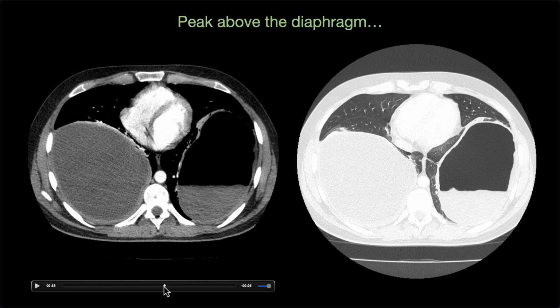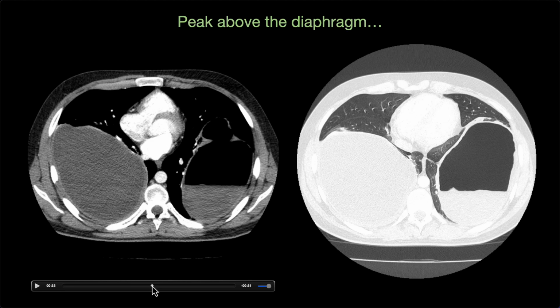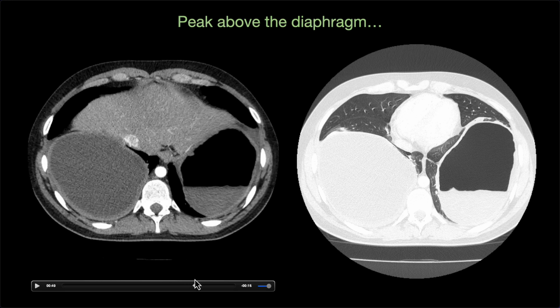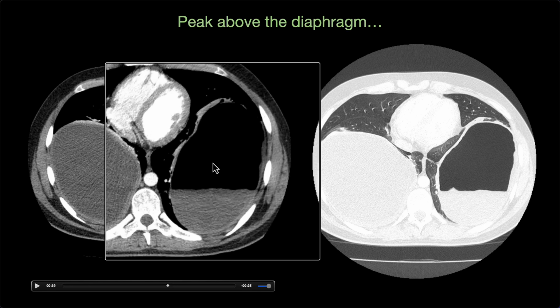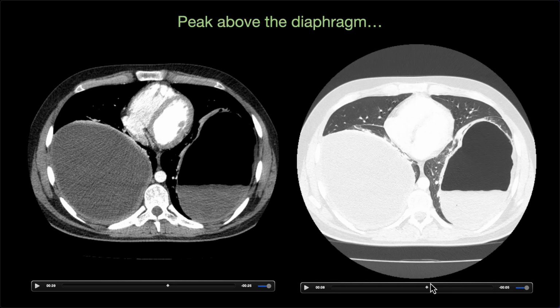When talking about hydatid disease, it is unavoidable to also talk about lung involvement, as it can be quite common in addition to involvement of the liver, spleen, and peritoneal cavity. And here we have two very large cysts filling the lower lobes, one of which has ruptured and one of which has not. And obviously the cyst that is ruptured has this large and impressive air fluid level within it.